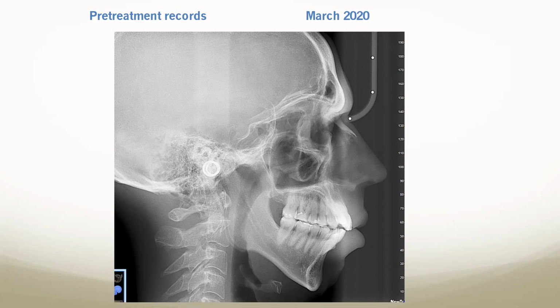No, no, no. I'm looking just to fix my crowding. Okay, then this is the short way. We don't move the molars, we don't move the premolars, or if we move them very, very, very little, and we fix the problem that the patient is coming for.